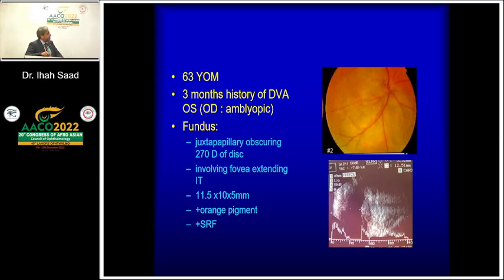This is the first case treated in Egypt in March of 2003. The tumor here was due for enucleation really, but we were starting the service and we had the plaques and they were hot. You can see the tumor around the optic nerve. There is a natural resistance to infiltrate the optic nerve.